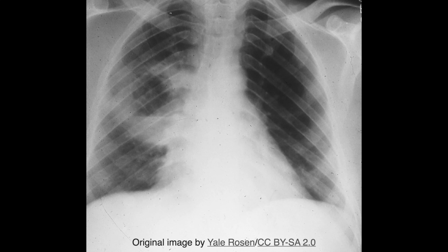A lung abscess typically appears as a focal round mass with a central cavity and a gas fluid level. The outer wall of the cavity is poorly defined due to surrounding consolidation, while the inner margin is relatively sharp. Within the cavity is a collection of gas and fluid. A sharp horizontal line divides the dark radiolucency, the gas, from the dense opacity below it, the fluid.